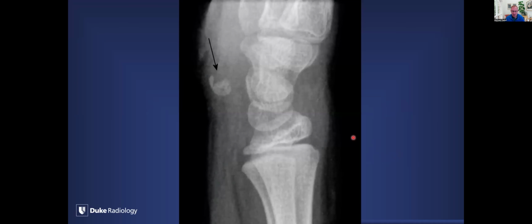There we go. Okay, so I was encouraged to show some unknown cases initially. This is something that usually first, second, third year radiology residents may misinterpret. So we have a lot of developmental variants.